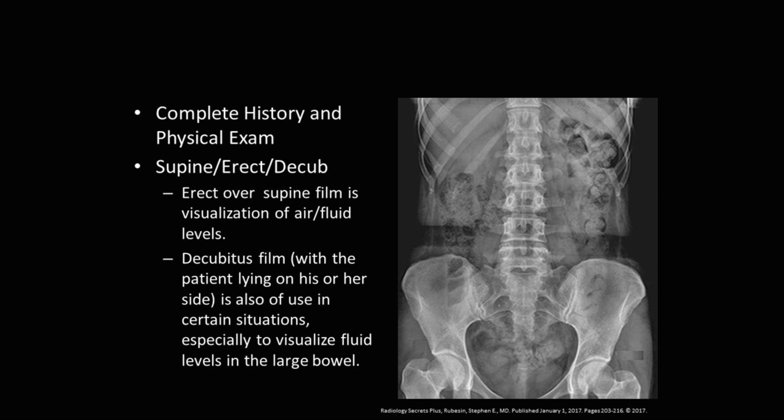Then there's different positions: supine, erect, and decubitus. Erect over supine, you'll have visualization of air fluid levels. Decubitus film, not quite as often used as it used to be, but essentially it can be used to visualize fluid levels within the large bowel.